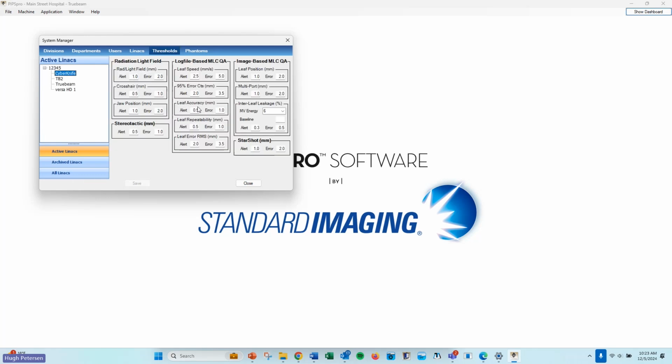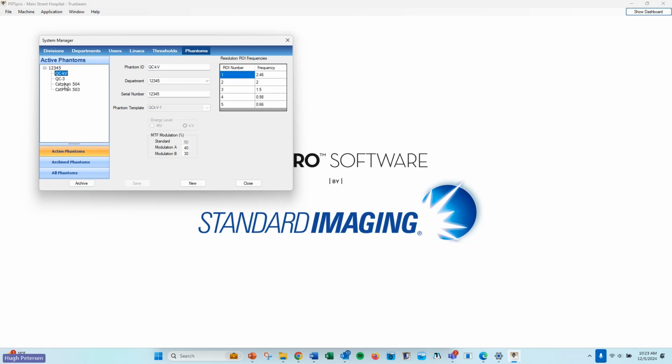Thresholds, like I mentioned, all the thresholds for the different test results are preset for TG142, but they can be loosened or tightened as you see fit by just going in and adjusting those numerical entries. And then finally, control of the phantoms here.